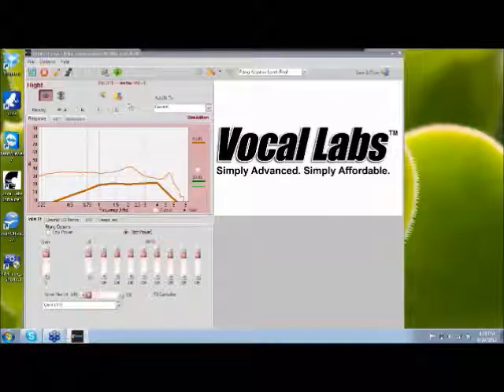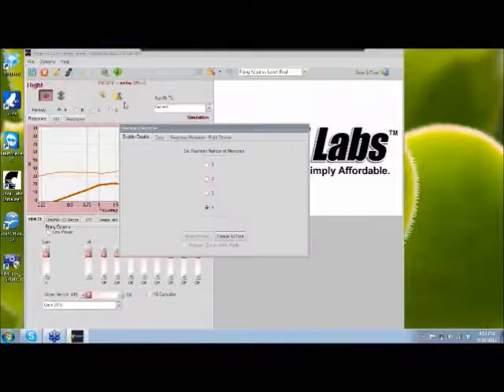So the second thing we want to do when we go in here is pick our number of memories, okay? If your patient isn't very mechanically inclined or you want to limit them, this is where you open this up and you can limit the patient to 1 memory if you like, 2, 3, or 4. For my purposes, I'm going to do this probably one of the more advanced ways. If my patient was, say, in their early 50s and pretty active, maybe still working, I would recommend giving the patient 3 memories, okay? You can cancel and close at any time.